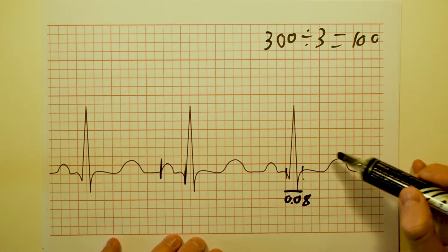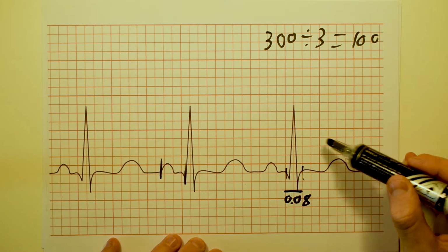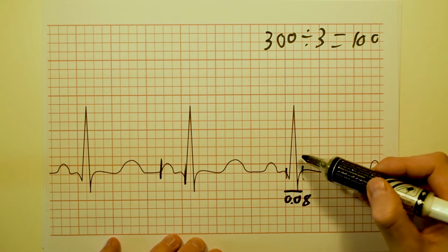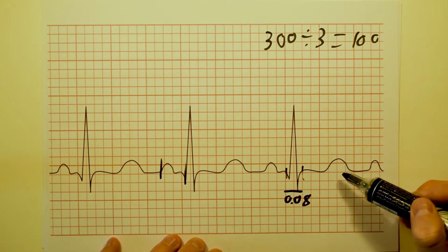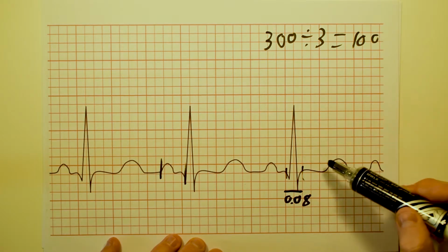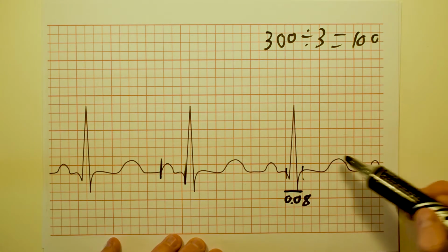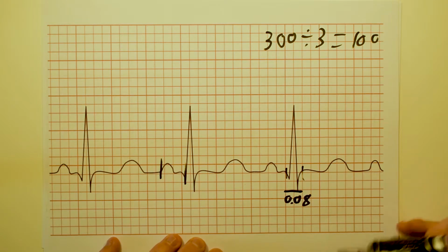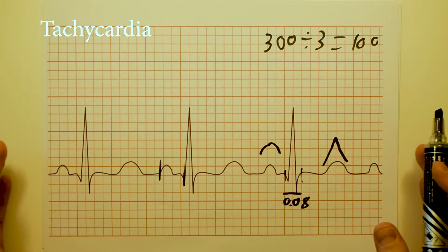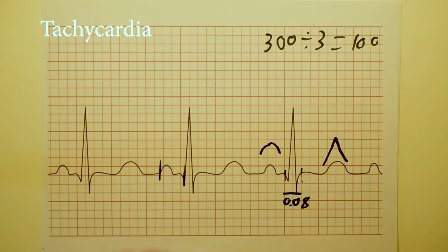In terms of T waves, what you want to have a look at is whether it is bigger than 1/3 the R wave. If you've got a really small R wave and a really small T wave, that's normal. But if you have a normal looking size R wave and a T wave that is half or bigger than that, then you know that is a large T wave. We have assessed this ECG. We can see that the only thing wrong with it is that it is a bit fast. So that can be called a tachycardia, a fast heart rate. Let's move on to the next ECG.